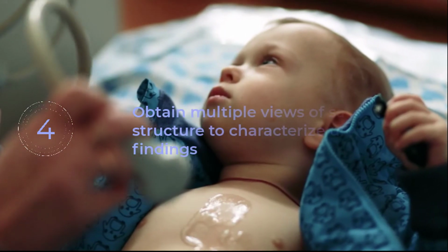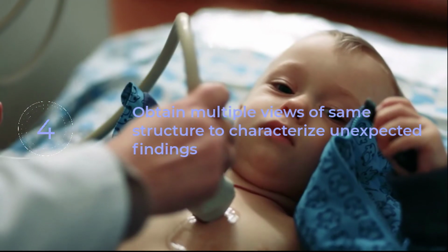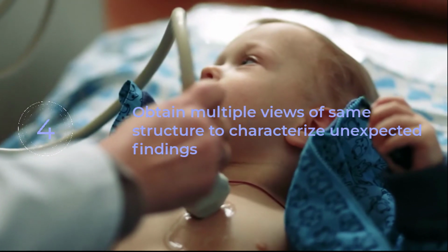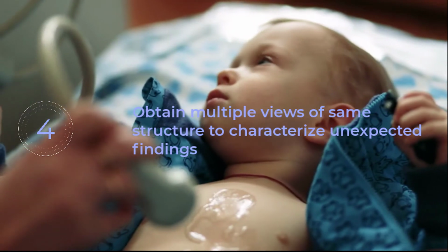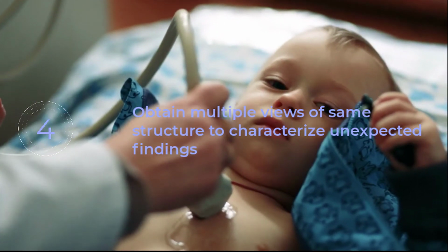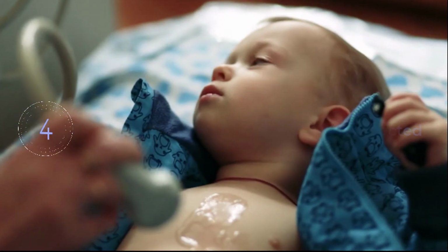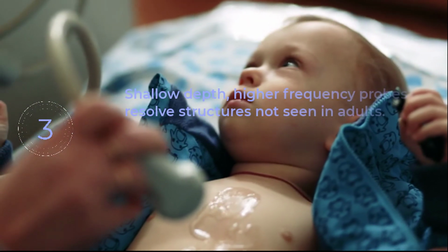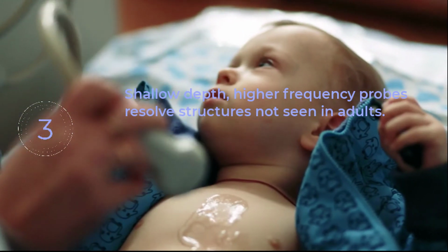Multiple sonographic views of the same space can help clarify questionable findings and usually require only minimal time. For example, if you suspect pericardial fluid in subxiphoid views, correlate that with a parasternal long view. Trace pelvic fluid is not as likely pathologic if the right upper quadrant is normal. Shallower depth to target and higher resolution probes can produce findings in children not seen in adults.